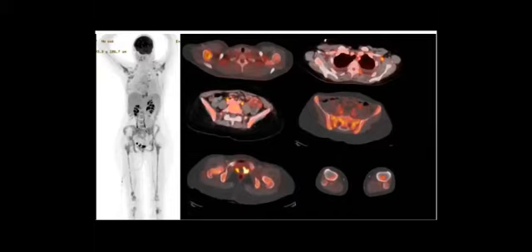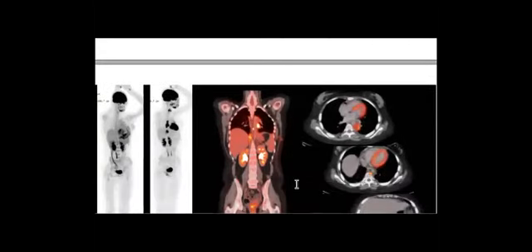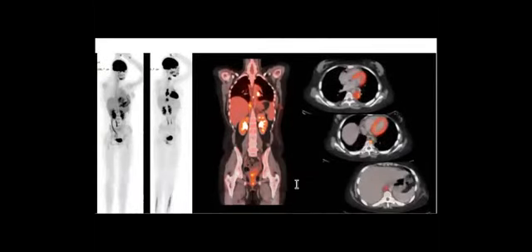Okay, so this one is not easy to get, but just to know that this patient has what is called alveolar rhabdomyosarcoma, and there is cord compression, and that's why they requested FDG PET-CT for him. So it can be lymphoma, leukemia, and it can be something very rare like sarcoma, one type of sarcomas.